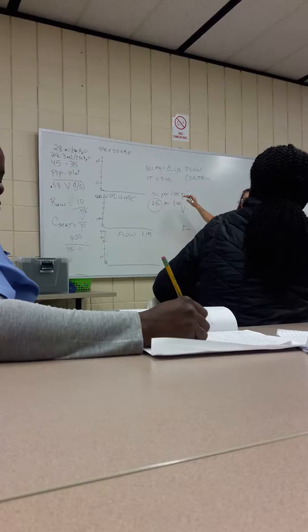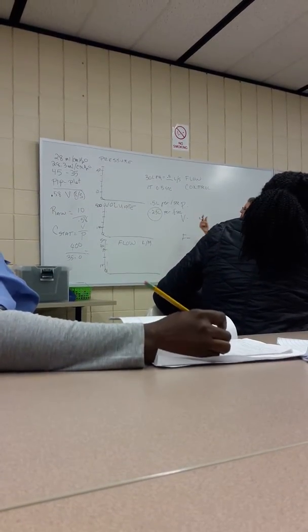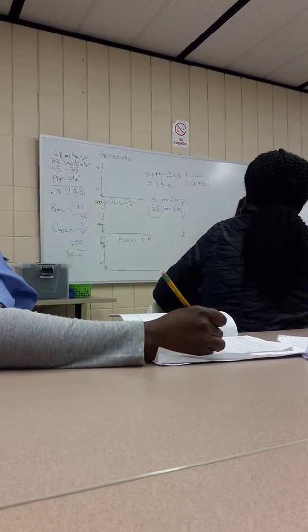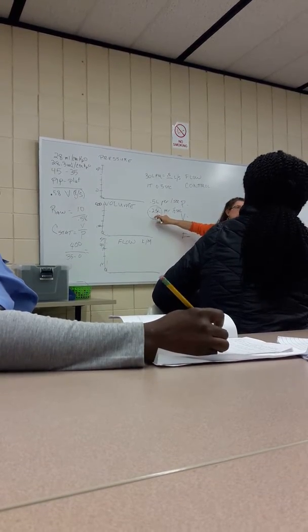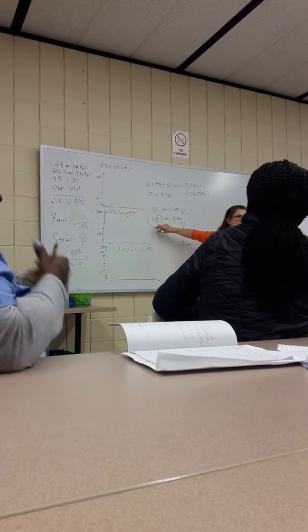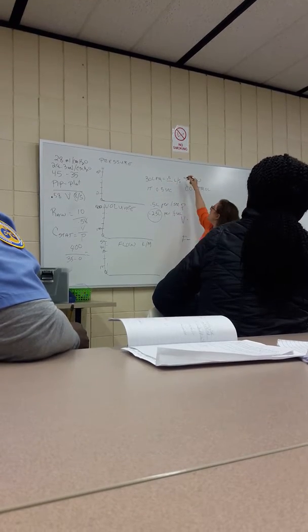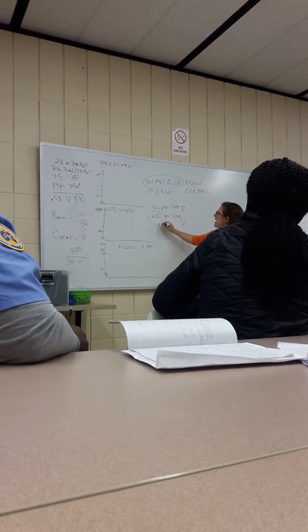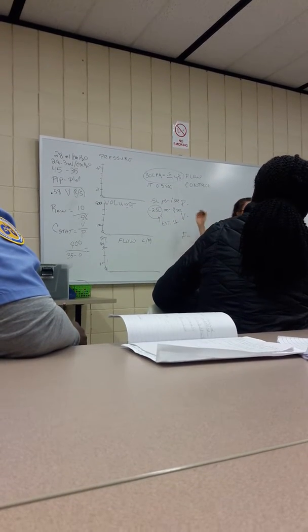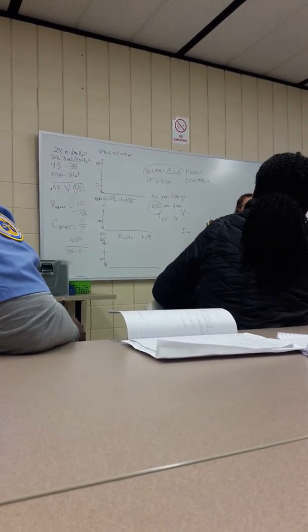You are estimating that based on normal compliance and normal resistance: if I set the ventilator for 30 liters per minute and let that run for half a second, it should deliver somewhere around 250 mLs, or 0.25 liters. This is my estimated tidal volume, because the only thing I'm setting is flow. Based on the flow and how much time I let it go to the patient, I should get a tidal volume of about 250 mLs.